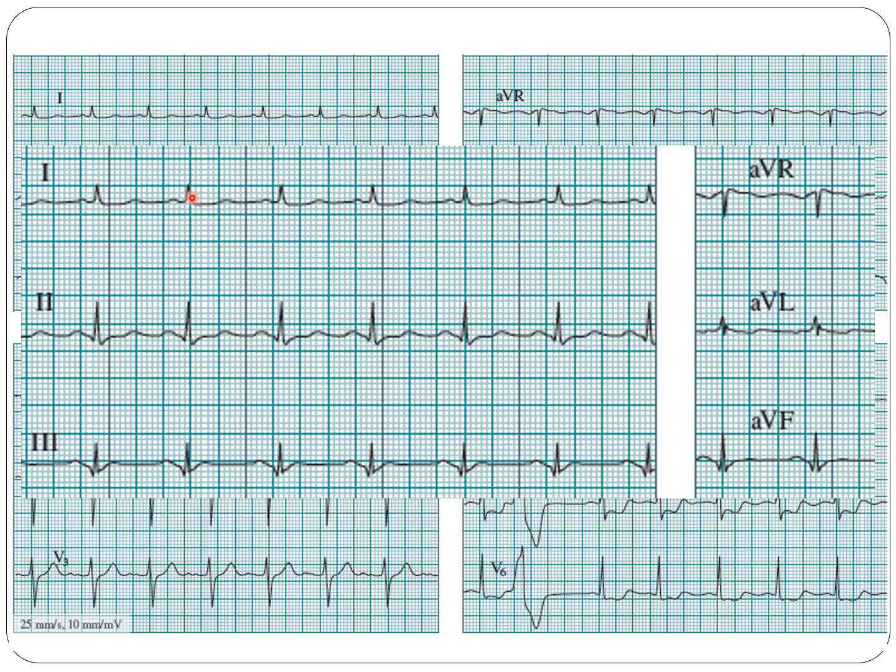The heart rate, because it's rhythmic, you can calculate by looking at the big square between the RR interval. Here we do have 1, 2, 3, 3.5. So this means the heart rate is between 75 and 100. So we can make it around 80.